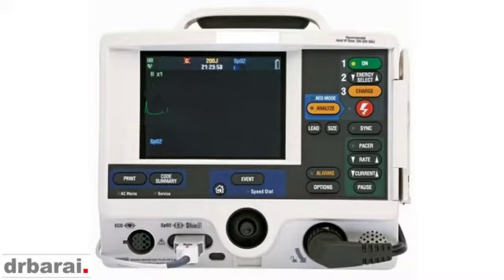So when the heart moves in a rhythmic way, the QRS complex height can be short and tall, and that is called electrical alternans. If we do a 12-lead ECG, that can show a beautiful feature of this electrical alternans and the features of the cardiac tamponade. But the diagnostic test is not the ECG. The diagnostic test is an echocardiogram. So this is just to demonstrate how the electrical alternans can be demonstrated in your defibrillator machine.